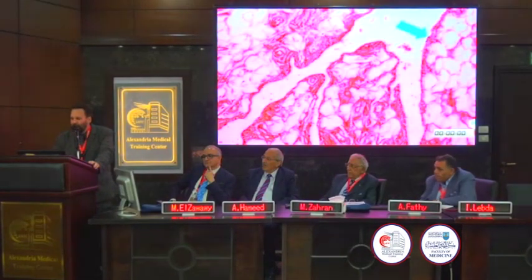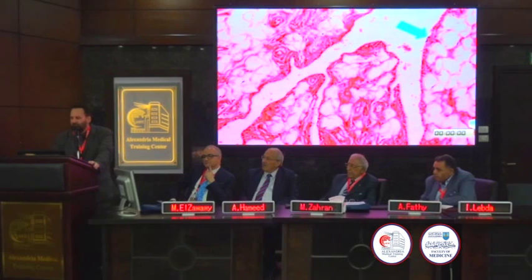And so here's an example. This is the synovial sheath. This is the synovium. And you see it's 2 cell layers. And what's around the synovium? Any budding pathologists here? Any medical students? Fat. So these are lobules of fat.